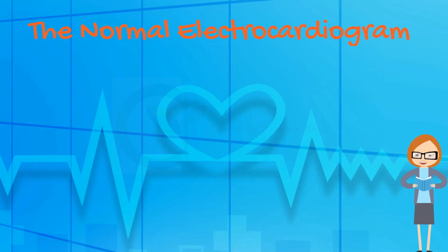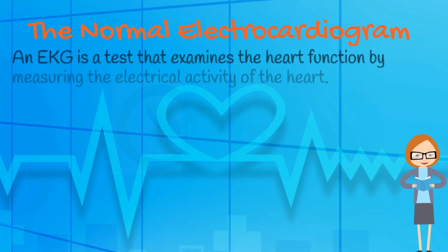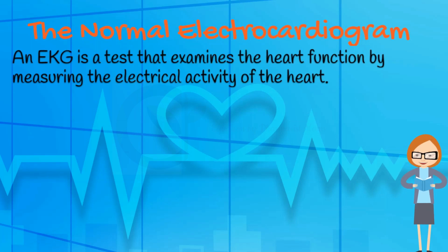An electrocardiogram, or electrocardiograph, that is ECG, or EKG, is the same thing. Electrocardiography, or ECG, is one of the most vital and readily used screening tools in clinical medicine. It is inexpensive and easily obtained in both the inpatient and outpatient setting. An EKG is a test that examines the heart function by measuring the electrical activity of the heart.